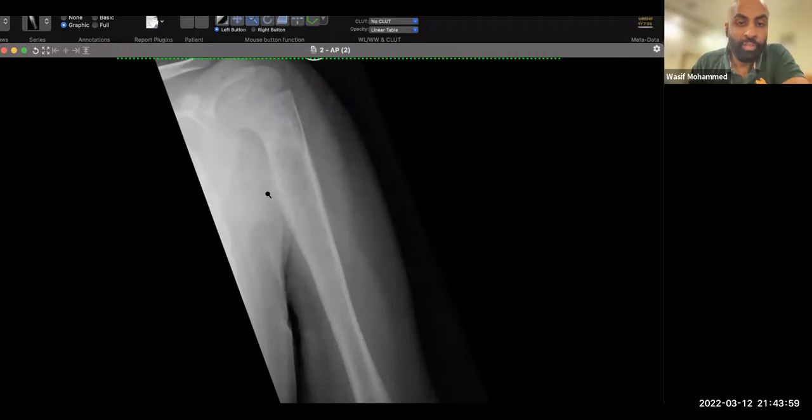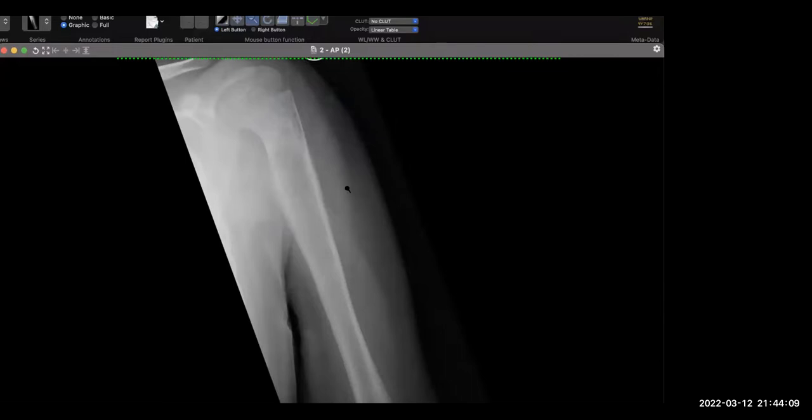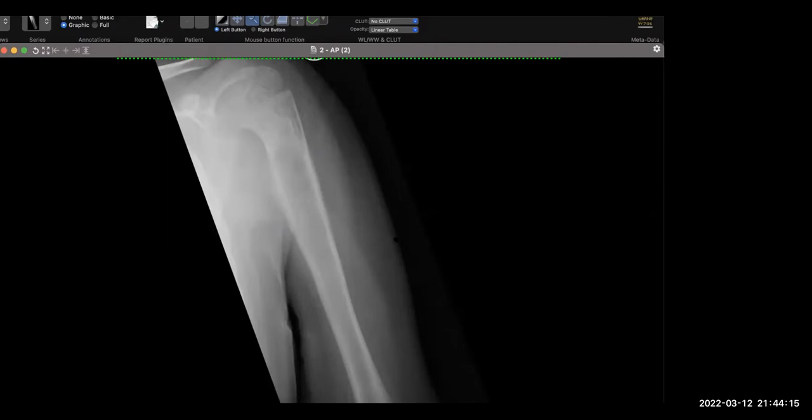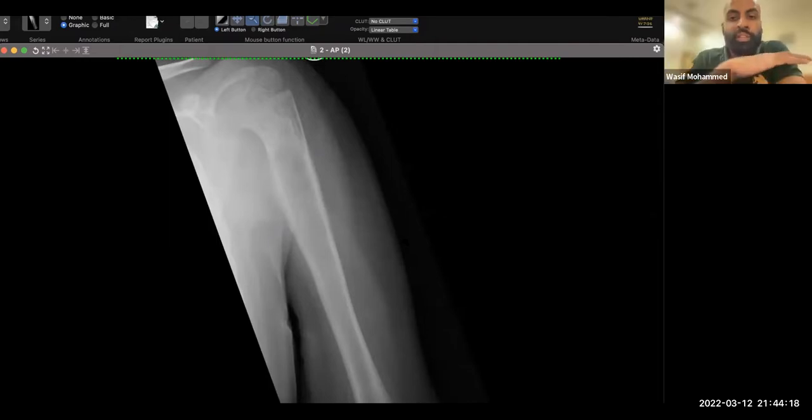There is mild irregular periosteal reaction. There might be some soft tissue component. There's no pathological fracture. And the matrix, there's no definite matrix. It has a moth-eaten appearance. There is some cortical thinning here. So 6, 7 things should just come spontaneously. It could be benign, it could be malignant, doesn't matter. You just have to describe them.